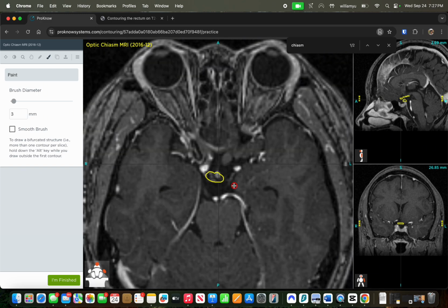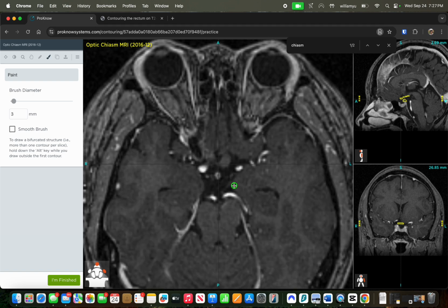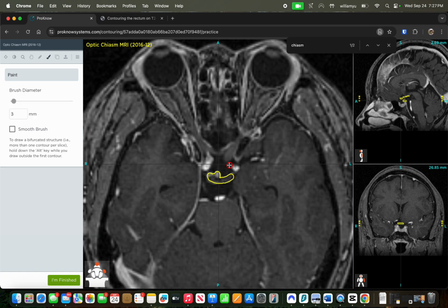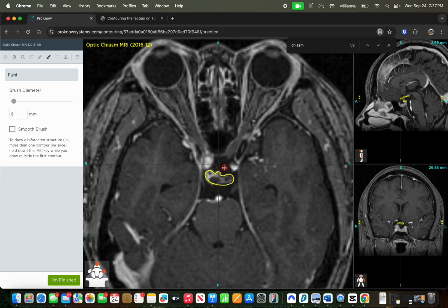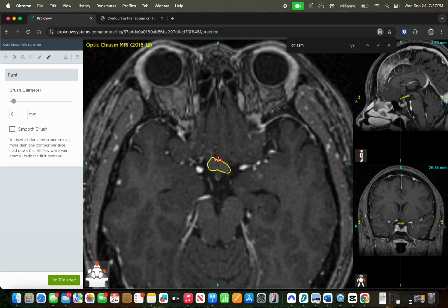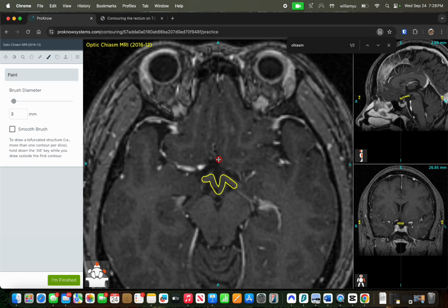We might have reasoned it correctly, but still not able to identify on the images what actually is chiasm. It's not that I don't know what the optic chiasm looks like and how it travels and nearby anatomical features, but I don't know what all that looks like on an MRI. So I'm just going to submit this and maybe there'll be a third attempt.